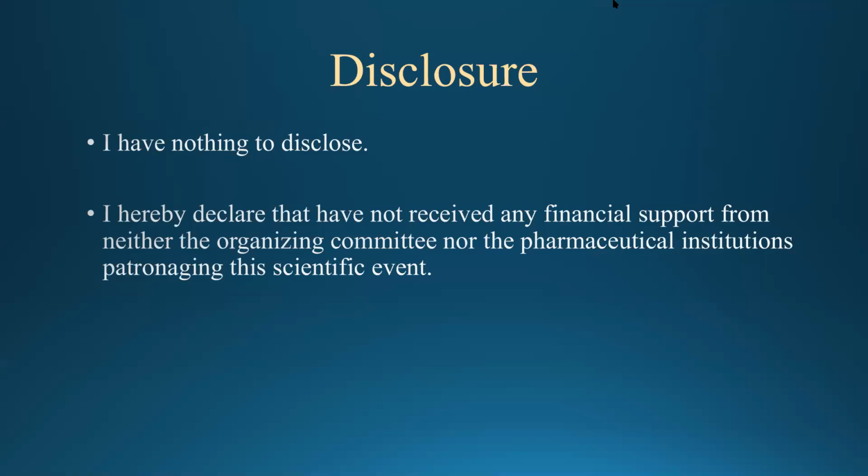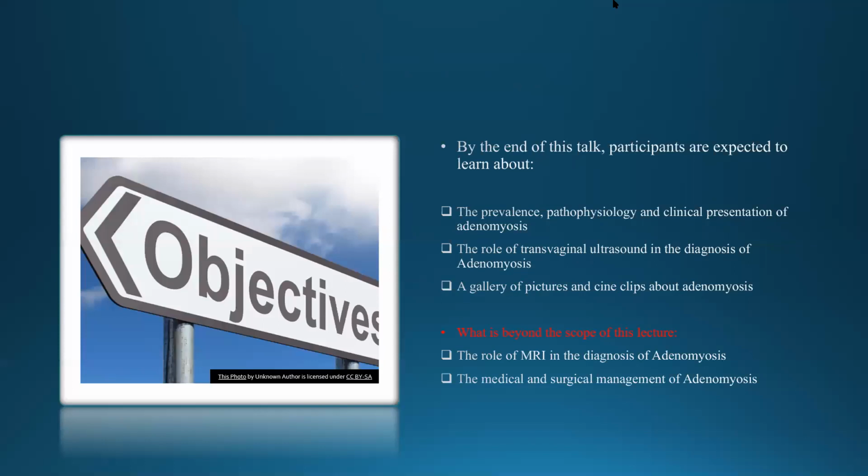My objectives for this talk would be to talk about the prevalence, and discuss the pathophysiology and the clinical presentation of adenomyosis. Our topic today would be about the role of transvaginal ultrasound in the diagnosis of adenomyosis. I'm going to show you a gallery of pictures and cine clips. What will not be discussed in this lecture is the role of MRI in adenomyosis, and the medical and the surgical management of adenomyosis.